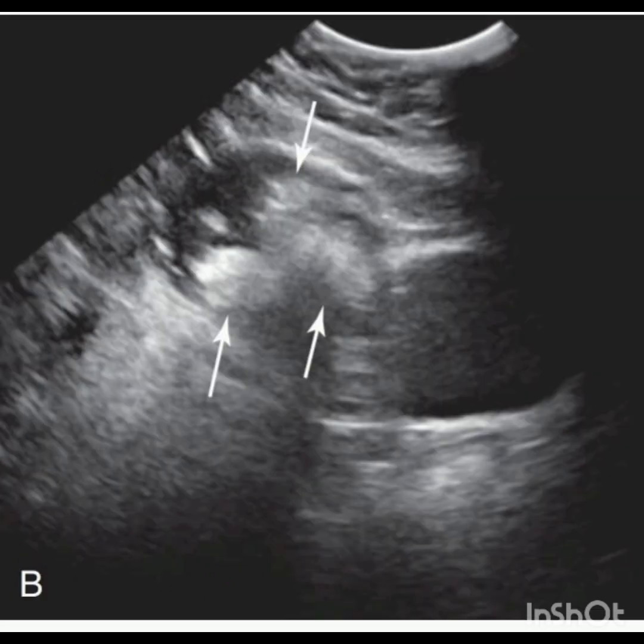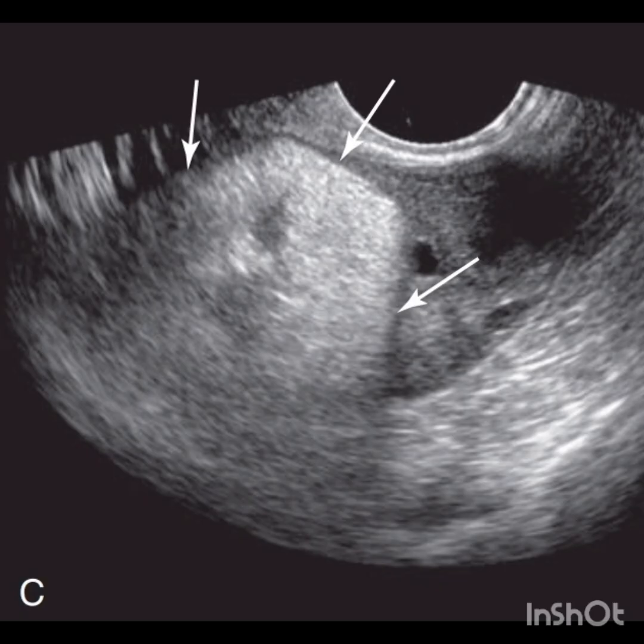In this image of a dermoid cyst, you can see multiple dermoid plugs indicated by the arrows. These are highly echogenic structures. Now in this image of a dermoid cyst, you can see the tip of the iceberg sign. As you can see, the dermoid is indicated by the white arrows, but the deeper structure of the dermoid is not visible due to the attenuation of the sound waves.